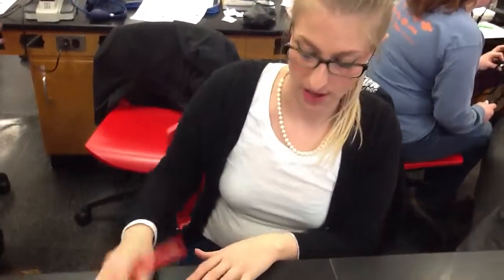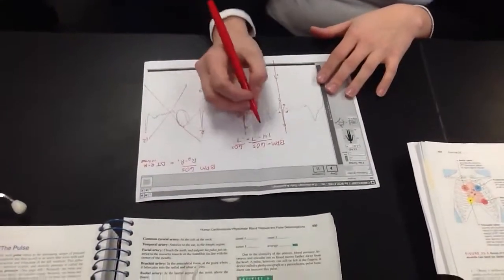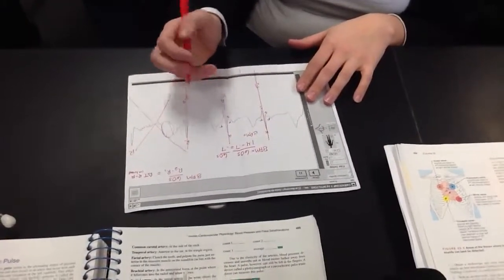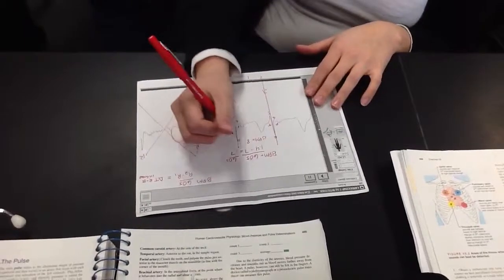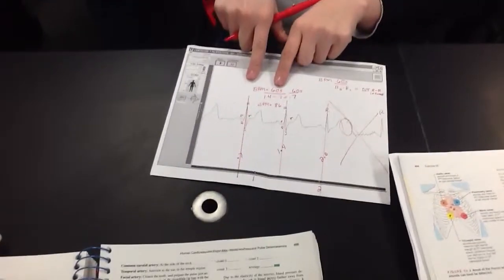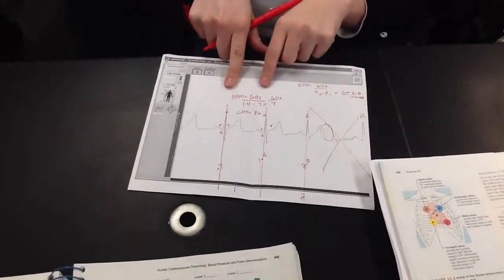Yeah. Okay. So now we're going to go ahead and divide that into 60. And what is our answer? It was like 85.71. Okay, so let's do 86 beats per minute. So our beats per minute for this first interval are 86. Make sense how we did that?